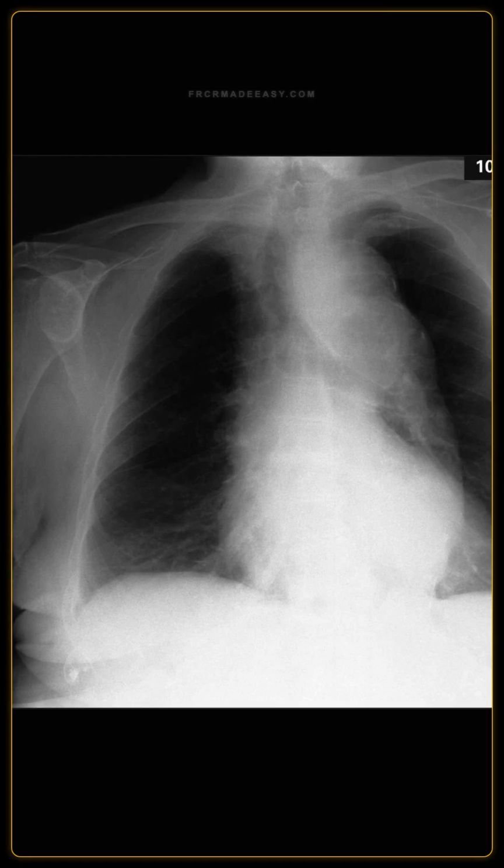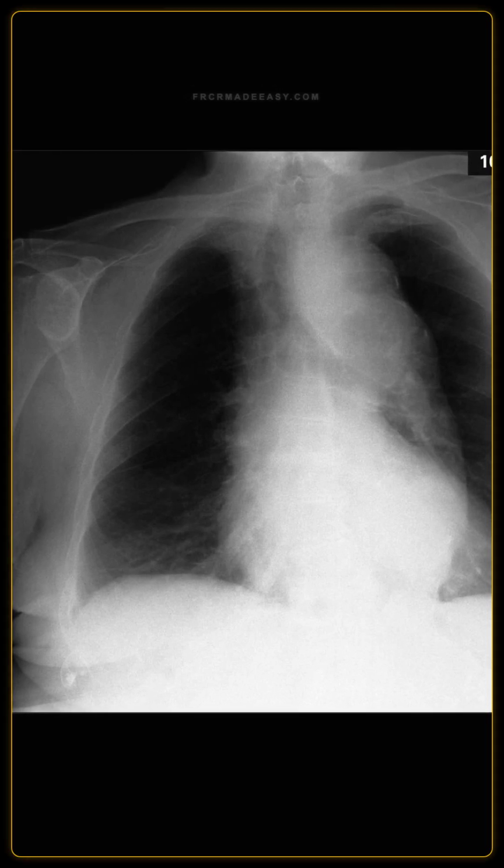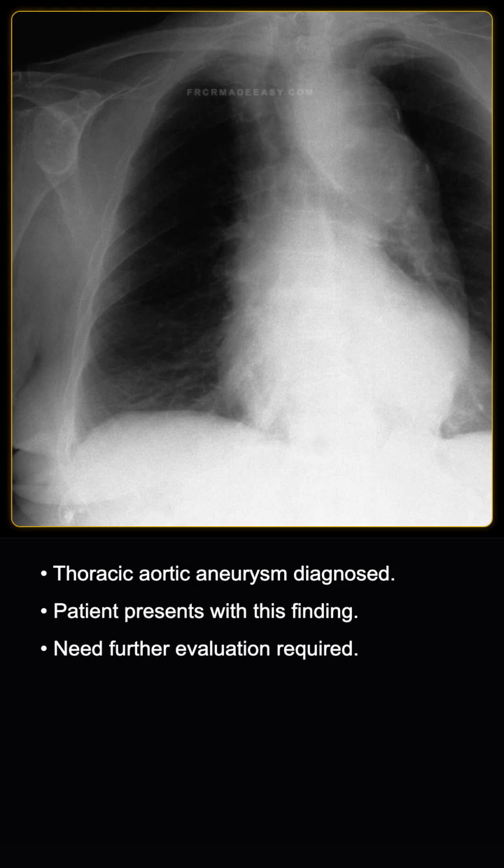Given these plain film findings, what is your primary diagnosis? The primary diagnosis is a thoracic aortic aneurysm.